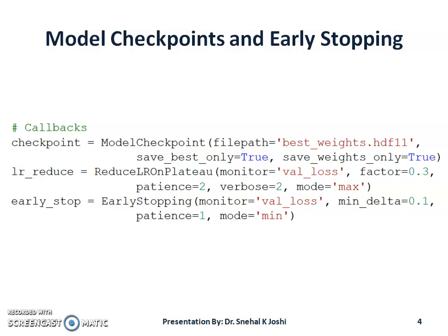Next trigger is early stopping. We are interested in only the very best model observed during the training, rather than the best compared to the previous epoch, which might not be the best overall if training is noisy. This can be achieved by setting the save_best_only argument to true.